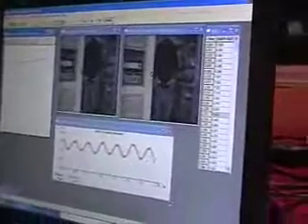Sometimes you don't care for the number, but you want to know at what position it was the fastest velocity, then you're mixing them up. That's fine. But I would choose the one I want to be real first. Like if I'm interested in velocity, that would be the first one I would choose. So you definitely do inches per second on that one, and the other one will show you where the heel strike was. Exactly. So we'll go ahead and we can actually leave this graph up as well.